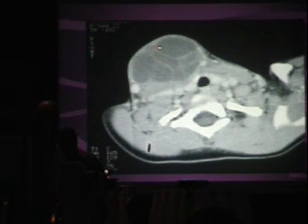Now we move to a slightly different appearance. What if you have multiple different septations that are going into multiple different anatomic compartments? What is this? Cystic hygroma. What's a synonym for cystic hygroma?